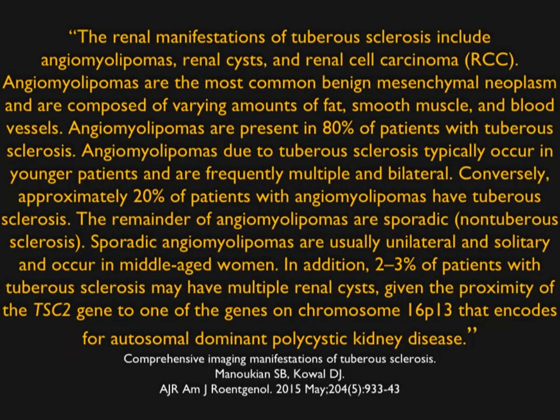Surely in the sporadic cases, it depends how much fat there's present. In the patient with tuberous sclerosis, lesions are multiple and truly contain more fat. So it's something to consider. Now, not every patient with tuberous sclerosis has AML. They also can have renal cysts, and it very much depends on the specific genetic defect the patient has.